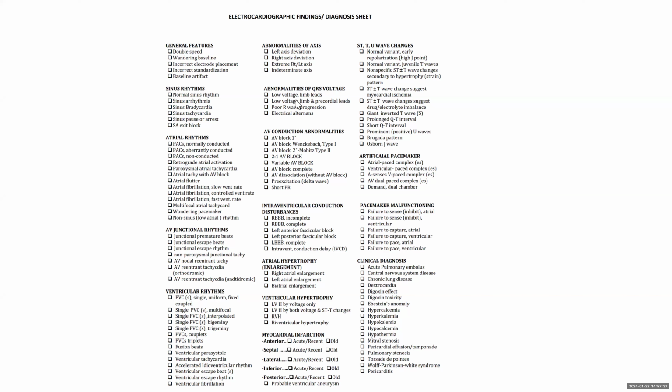In this sinus tachycardia there are no spikes because the pacemaker didn't need to do anything. But you know it's dual chamber because there was a paced beat. So this is where this code can be used. It's demand. It's not doing anything for the most part because the intrinsic rate is high enough that the pacemaker didn't need to do anything.